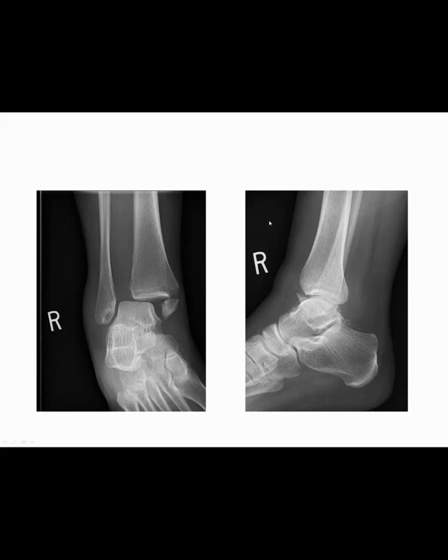So to summarize our findings, we have a fracture of the medial malleolus with resultant widening of the medial clear space. We have widening of the distal tibiofibular syndesmosis. So widening of these regions is suggestive of associated ligamentous injury or disruption, and we see that the tibia is subluxated medially. This is an unstable ankle injury and should prompt you to order radiographs of the tibia and fibula to look for a proximal fibular fracture, also known as the Maisonneuve fracture complex.